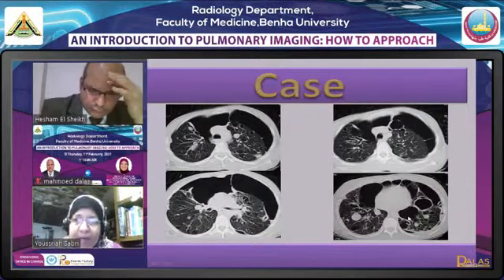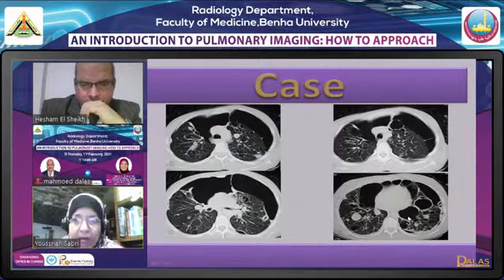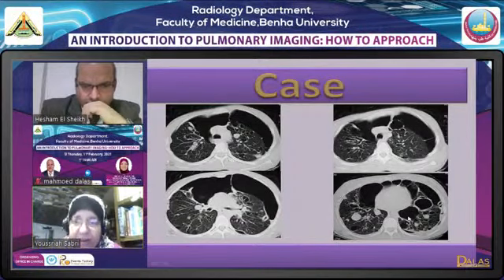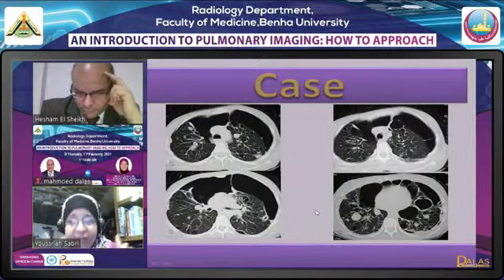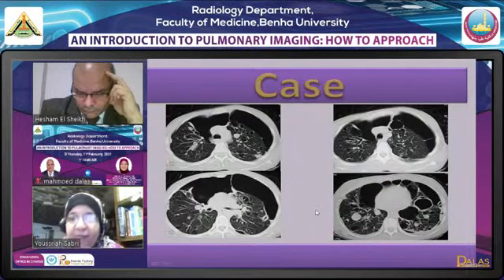in addition وده حاجه مهمه جدا I'm dealing غالبا most of the time يعني more than 90% with a female in the childbearing period. يعني اللام is classically affect females in the childbearing period. دي برضو important. يبقى اللام بيبقى الوول اهو واضح بتاع السيستات، وهذه السيستات بتبقى all through the lungs in a female with a childbearing period. وستيل برضو من باب الانصاف sometimes ساعات بيبقى لو يعني الكواليتي بتاع السي تي ما هوش كويس قوي sometimes it is difficult to differentiate. So I stick to all the points.